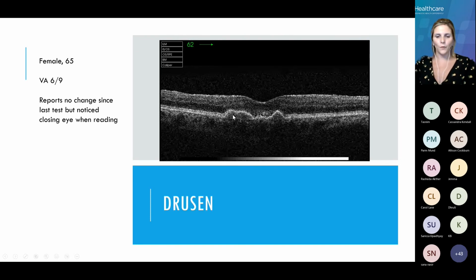So I'm sure you've all looked, I can't see on my phone, but you have got a drusen for this patient. So maybe some changes in relation to AMD, and we can start to see the pigment that's migrating off from the RPE into the retina. You don't tend to find this goes past the external limiting membrane, so you don't tend to find it in the intraretinal section sometimes. But it's important to note, and obviously being aware of this patient. Obviously, we know that they were an occasional smoker, so you could use this B scan to educate that patient.